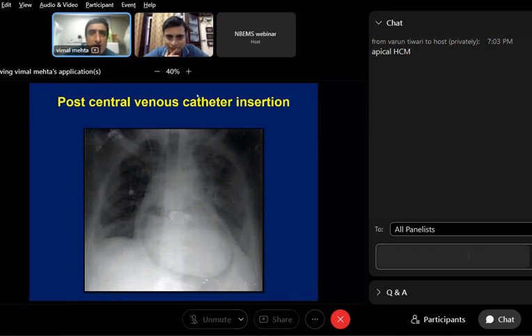Okay, actually I have not removed them. So what is there? Somebody was putting in a central venous catheter and went too deep. Pneumopericardium, very good. So you see air in the pericardium. It should not happen. You have to be careful. Okay.